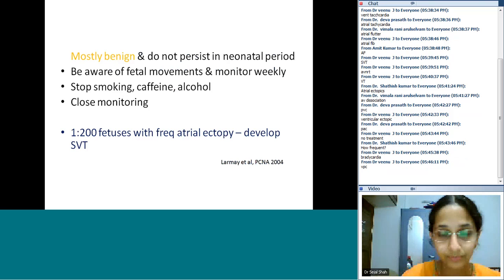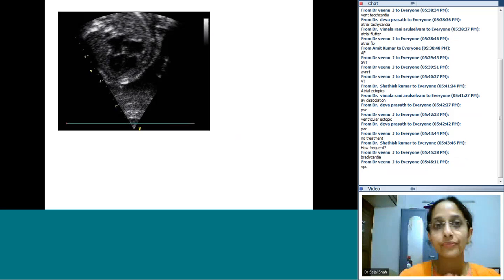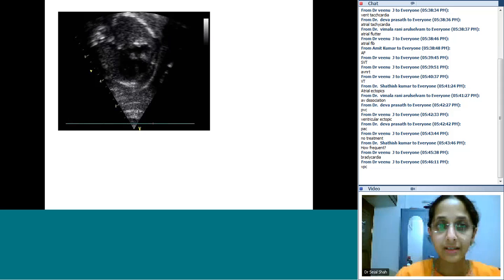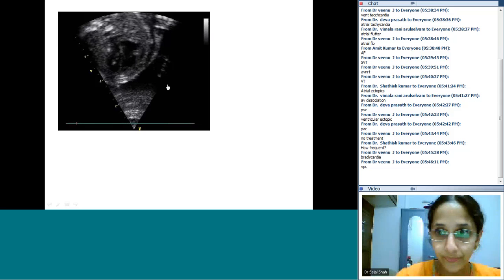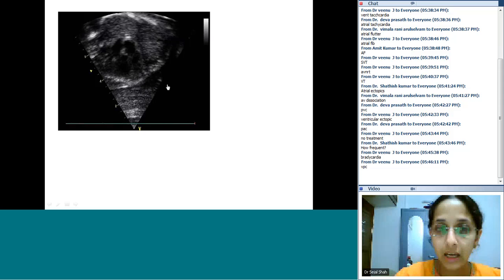Now we would come down to one running image, and if you could just see the image, you could feel that there is something wrong, not in the structure of the heart. So what is the diagnosis?